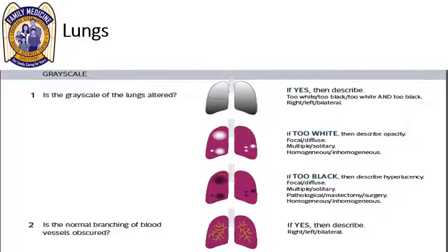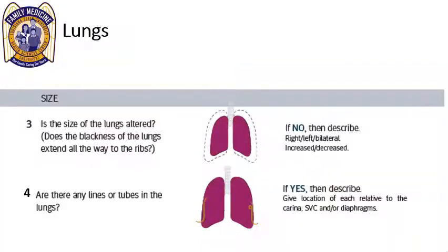If you have any type of obstruction of the blood vessels, when you have something like Hampton's hump, where you have this hyperopaque or hypoopaque region where it's so different than everything else, that could be a sign of a pulmonary embolism. And remember, the X-ray is not going to be the test of choice to determine if someone has a pulmonary embolism.